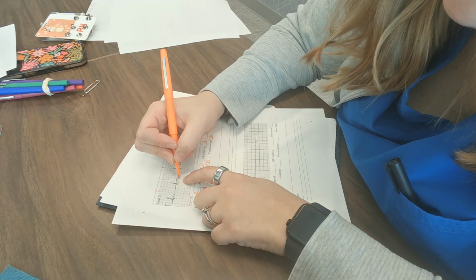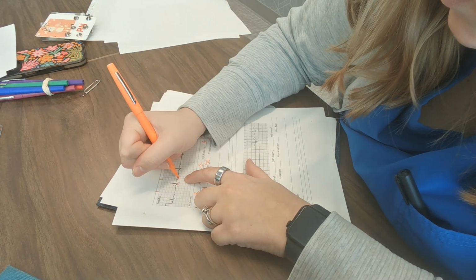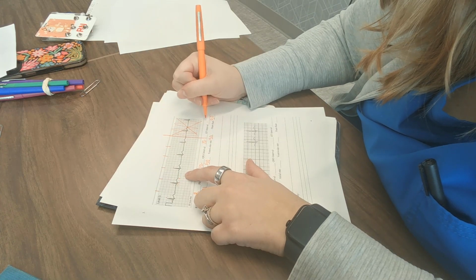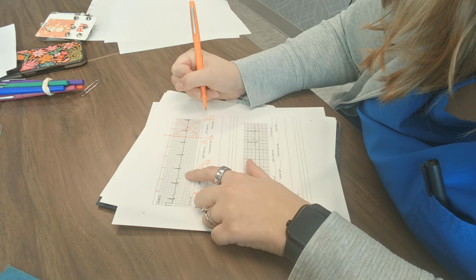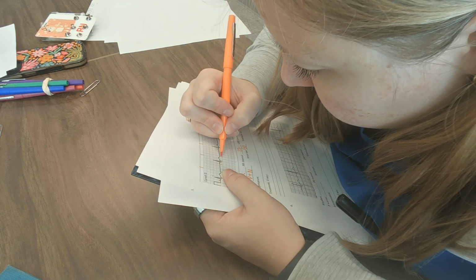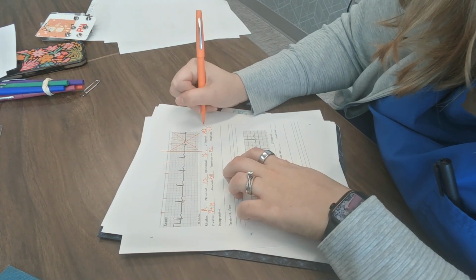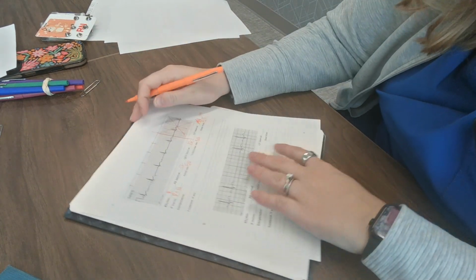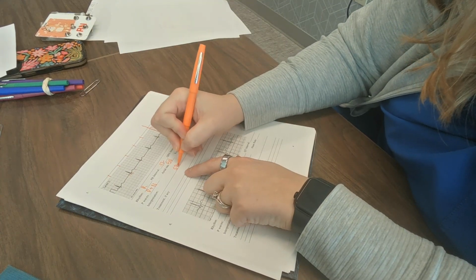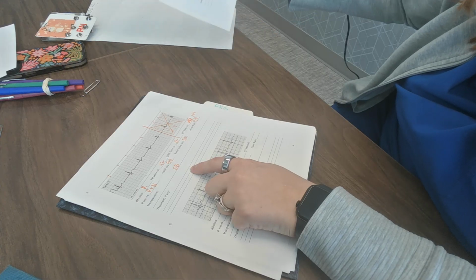So I'm looking at 2.36, basically 0.40, right? 44. Okay. All right. So what is this? This is just sinus brady. Okay. You can look back at the other one that we looked at for sinus bradycardia.